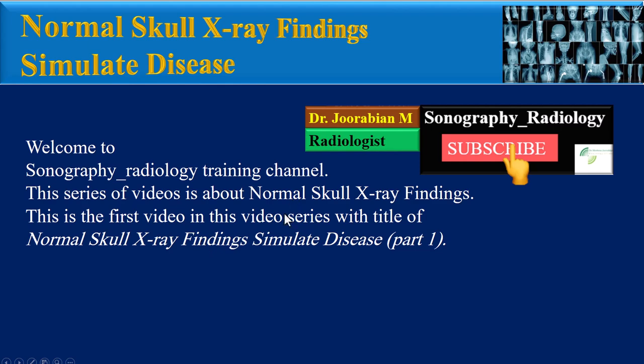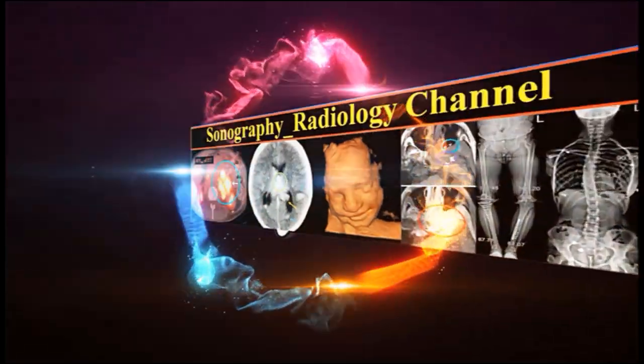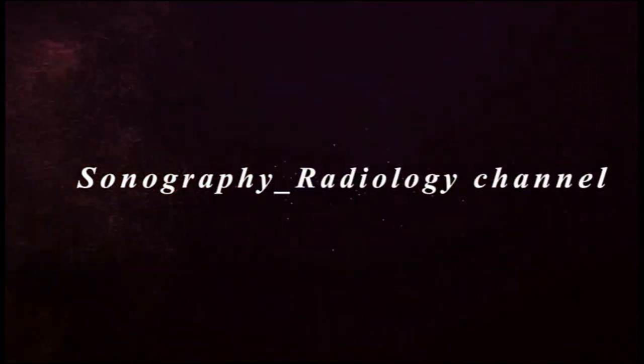This series of videos is about normal skull X-ray findings. This is the first video in this video series with the title of Normal Skull X-ray Findings That Simulate Disease, Part 1. In this brief video, we will review a few cases of normal skull X-ray findings together.